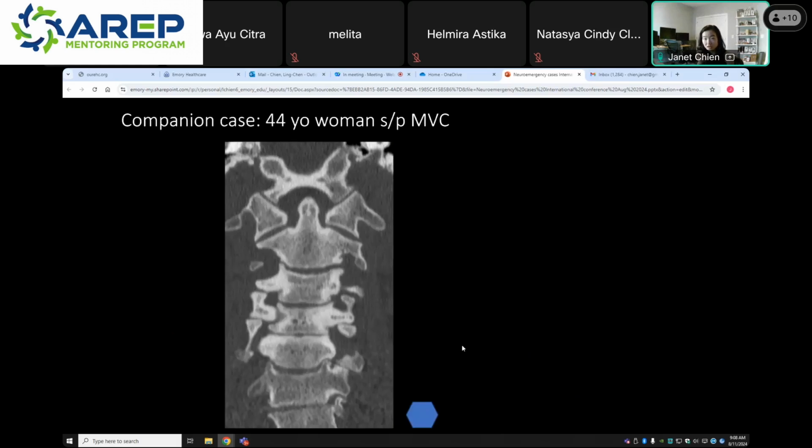This is a companion case. It's a 44-year-old woman who was in a car accident. Does anybody see anything here that they worry about?